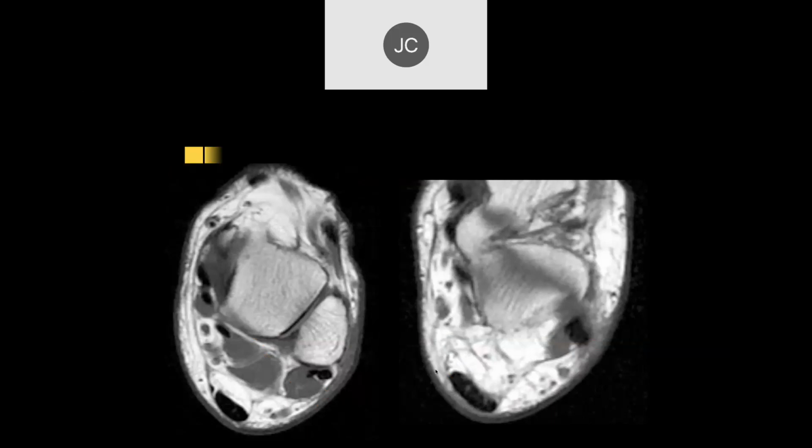Okay, Robert. Okay. Hi. Looking at the ankle here.